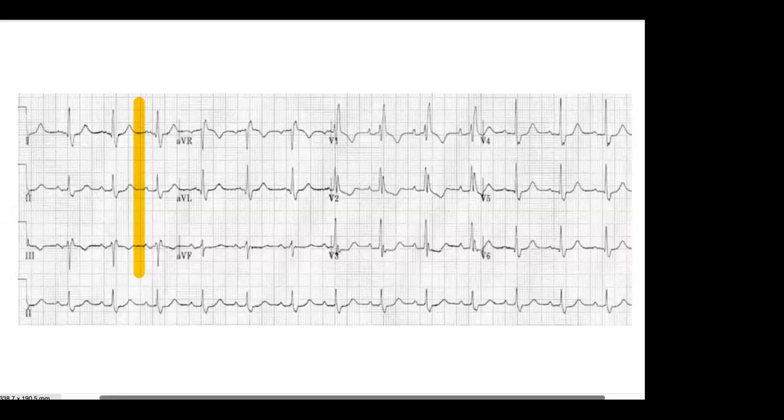Yes. Right. So if you compare it to other QRS complexes, even though we don't have the scaling and the timing here, if this ECG had been printed out clearly, you would have found that the QRS complex is on the limit, almost, if not more than 120 milliseconds, so it's on the border. But what I wanted to draw our attention to is the axis deviation.